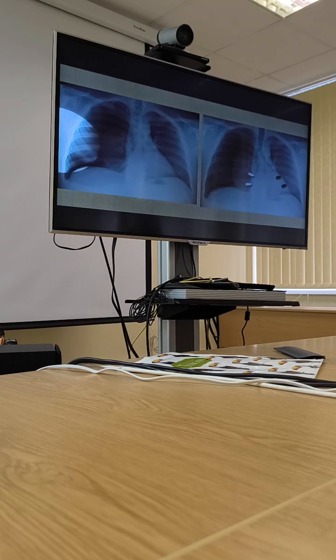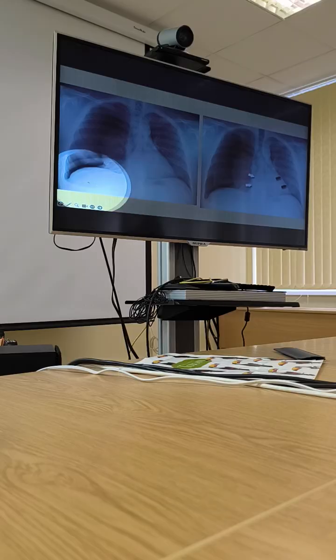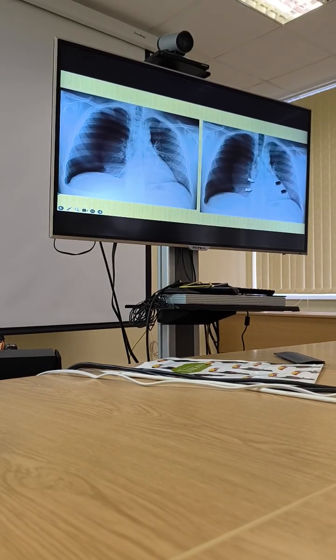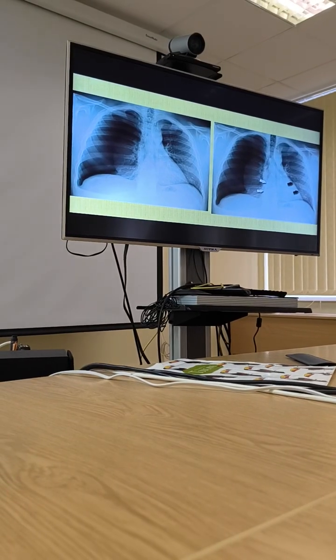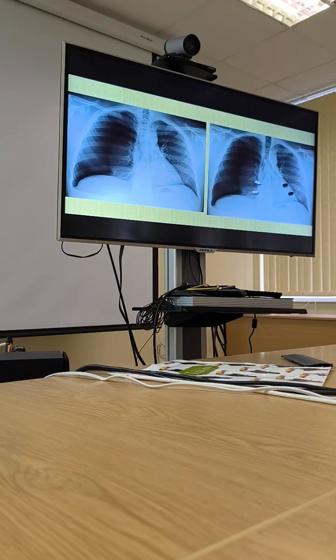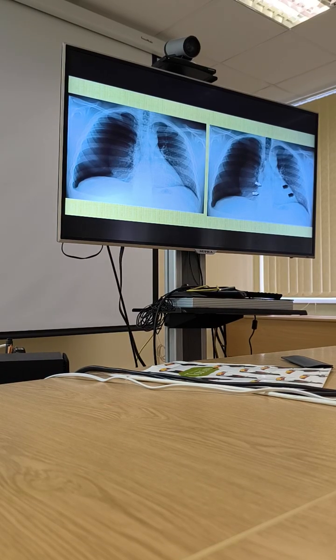If you pay attention, there is a horizontal line. This is pneumohydrothorax. And if they see the displacement of the mediastinum, what should they mention? That it is a tension one. So this is how it can work.